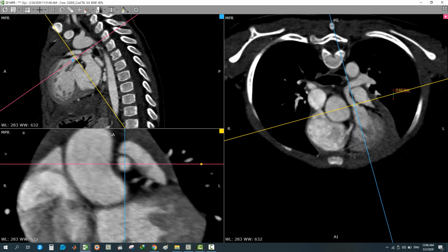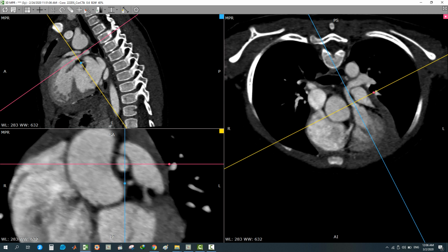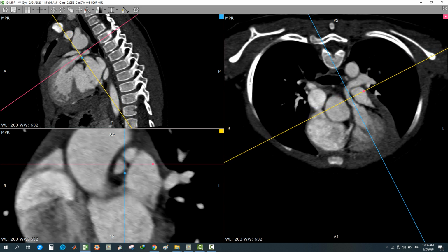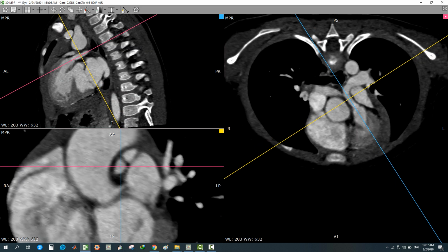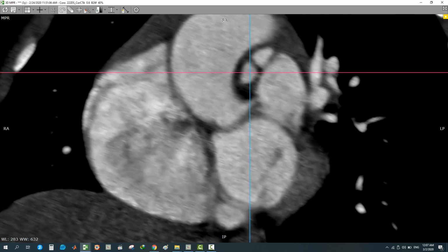A proximal MPA like this. Yes, this one. You'll get the end on here, the proximal MPA. Then scroll in the end on, upward till the bifurcation to RPA and LPA. Before the bifurcation, just align again to measure the pre-branching MPA, main pulmonary artery, like this. This one, the pre-branching, you will measure these diameters.